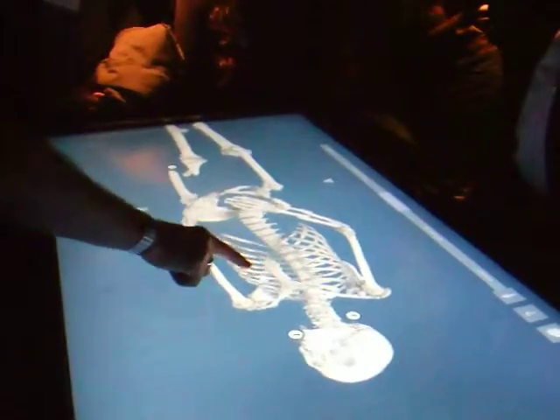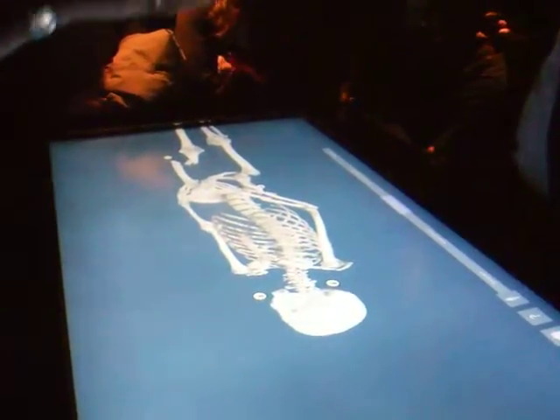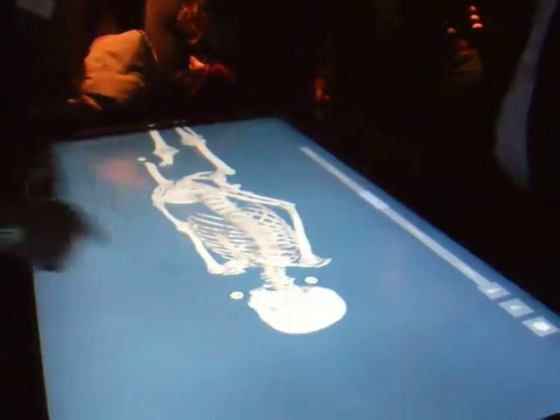You can clearly see the break here, here, here, broken bones here and here. These are all quite traumatic injuries and would have been very serious, but could have been survived if she'd received treatment very quickly. She might not have died. But unfortunately, there's one injury, and showing this to a doctor, they immediately see it. I've shown this to doctors and they immediately see, oh, that's it.